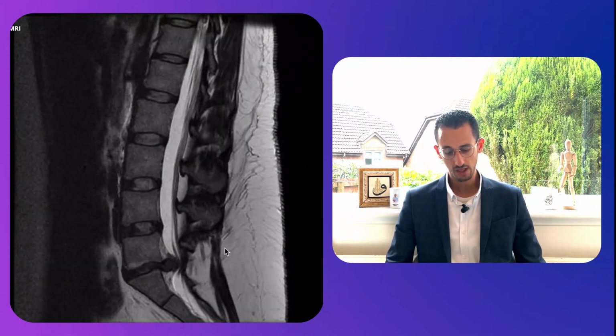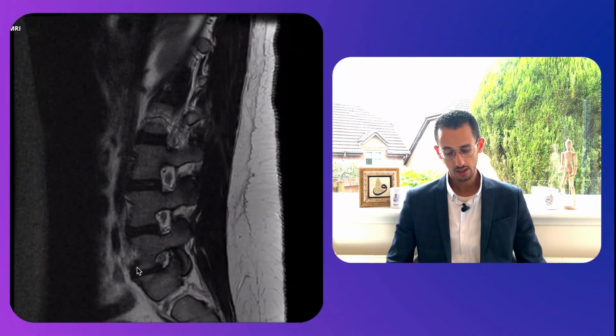If we move the image a little bit, you can see that's very, very obvious. It's kind of going all the way through the canal. So that's causing pressure on the cauda equina. So if we go from the right to the left, as you can see, that's all disc prolapse, which is hypointense. As we said before, we look laterally to look at the nerve roots. So in the foramina, this is the nerve root, looks fine. This one looks all right. This one looks all right. This one is a little bit squashed on one side, which is understandable. And on the other side as well, it's not a huge amount of pressure, but again, you can see the difference between this one and the others.